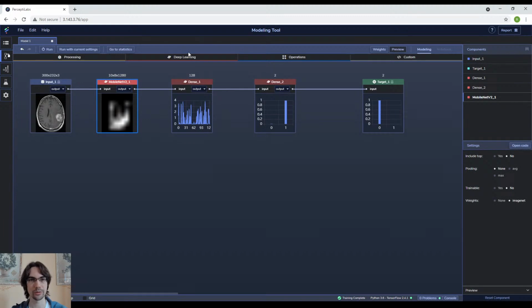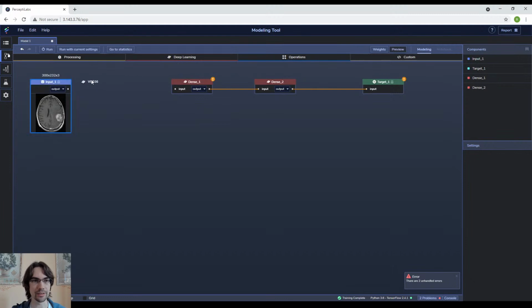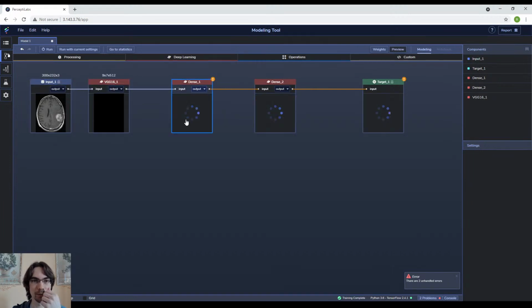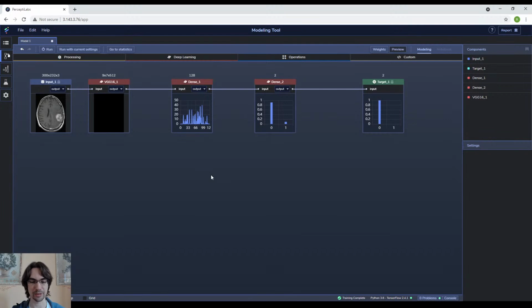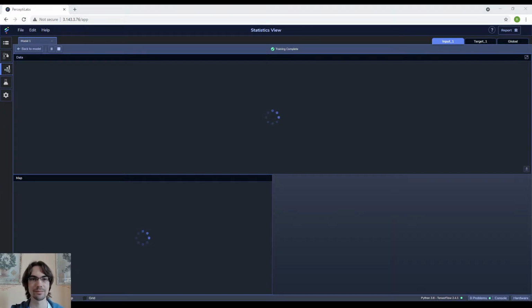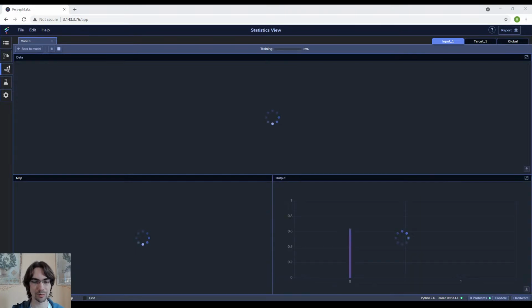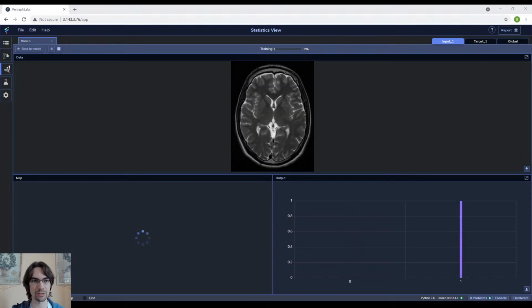So let's try swapping back to the VGG and see if that one performs better with the dropout. And after that, we'll do a quick test with ResNet, which is a much larger model, and see how that one performs. Let me write this down. So MobileNet dropout, I think it was 84.